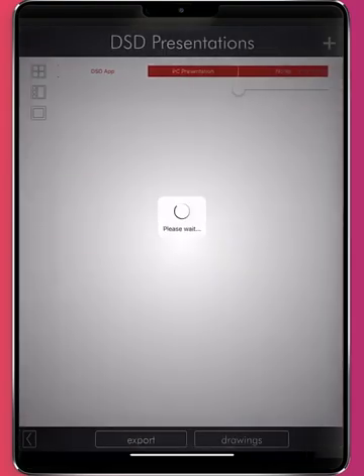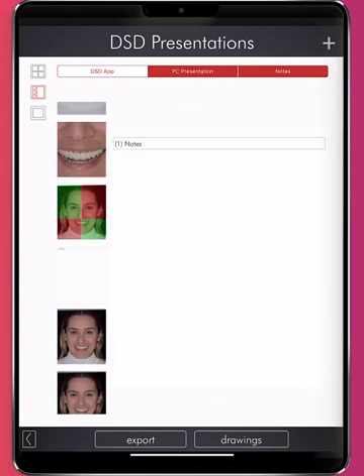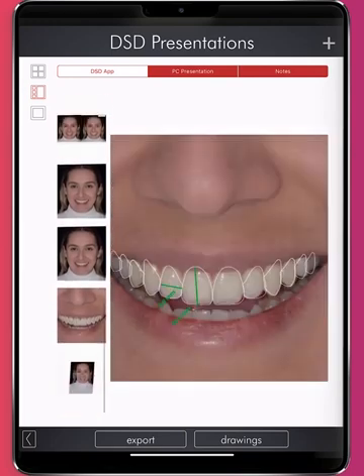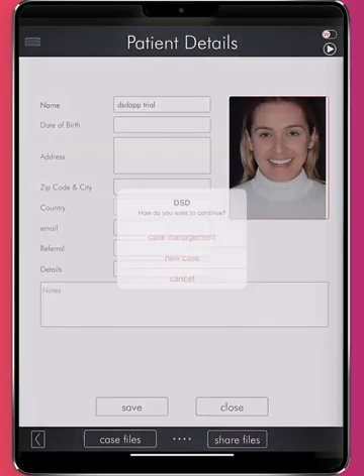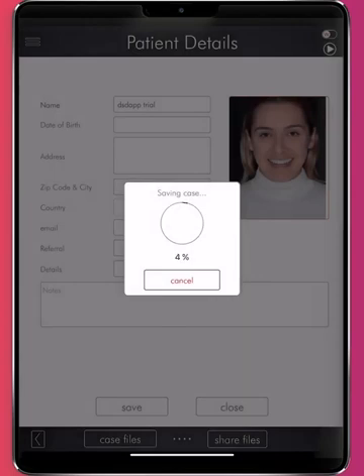In the case files, we have the complete documentation created by the app automatically. So as you can see, you have the facial flow, you have the shapes, notes, measurements, smile frame, shapes, every important information regarding your smile simulation. And you can save the case. The case management is gonna be populated with a new project called Smile Simulation. You can open the Smile Simulation, you can do changes, you can modify the Smile Simulation, and you can proceed, of course, with the treatment.